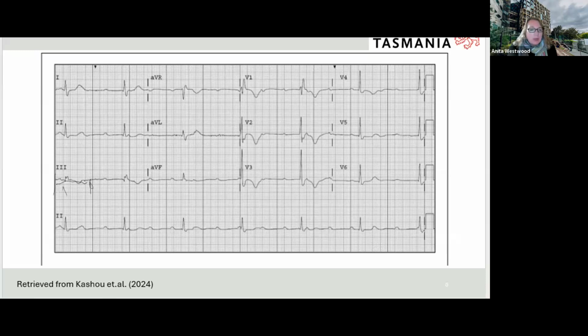So we're looking at that strip there. You usually start where you've got a complex, or start on that lead 2 across there, and count how many boxes you have. So for instance, start on a big box. You can see on lead 2 where that QRS has just come in. I'd start on that line. Now, how many big boxes across will you count for a 6-second interval? That makes sense to everyone?